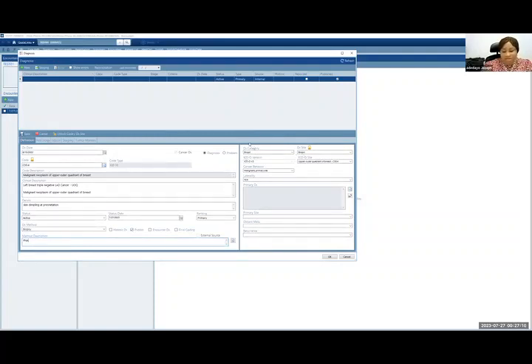Now, on this other side of the screen, most of the things again are automatically filled in. So breast, disease category is breast, disease site is breast. It has put the version of the ICD and put the description. And it has put the behavior saying that this is malignant. Laterality is something that is very important. And when we forget to fill it, again, it gives us useless data. So you have a bunch of breast cancers, but you can't even tell how many right breast cancers versus left breast cancers you have if you don't select laterality.